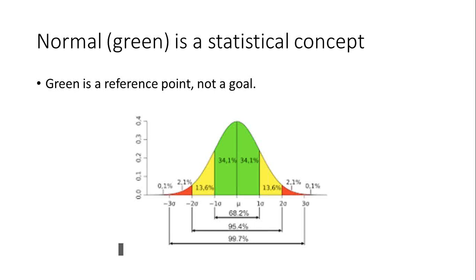I know Thatcher's had one all along, a basic one for doing Student's t comparisons, and it's a good tool. We've created ours slightly differently. We're focusing more on a clinical audience, and you all are not that interested in the statistical details, but in the practical application of them and how to use a compare tool so you can get the most out of comparing a pre-map and a post-map.